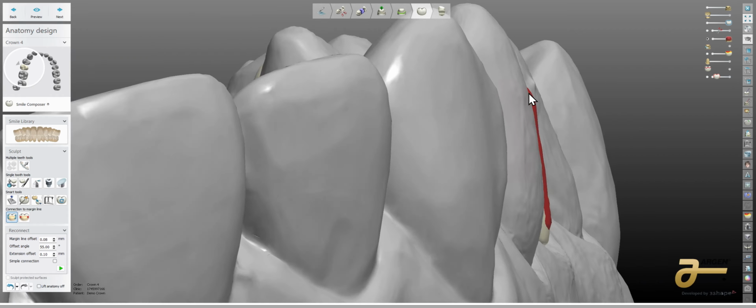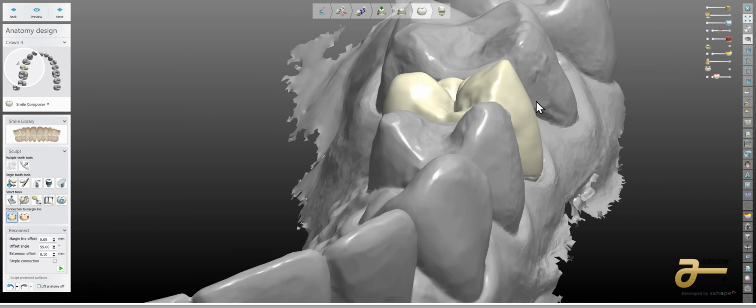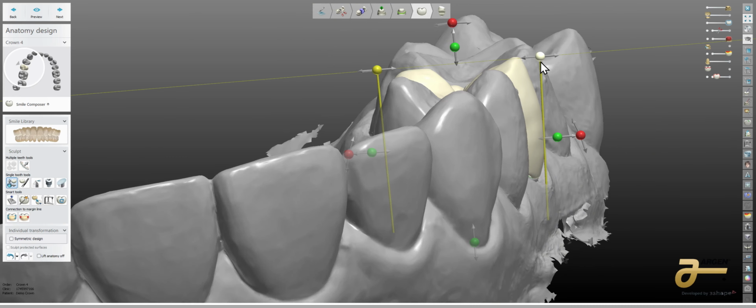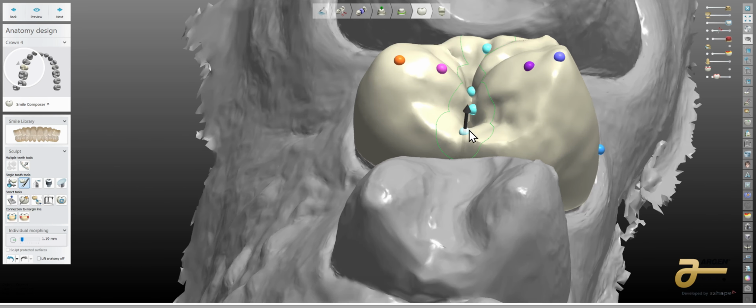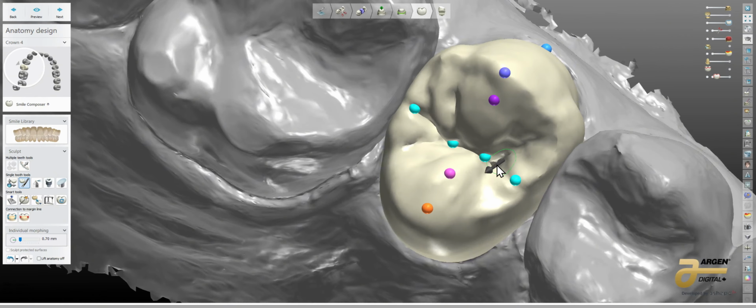And if we look at the contour, it's going to look over contoured if we're not careful here. But the very easy way for us to do it is use these sliders and then just go ahead and bring out the belly here a little bit. Come in here to our favorite tool, the tweezers, and I'm going to zip this down.